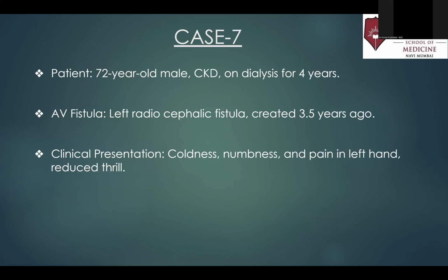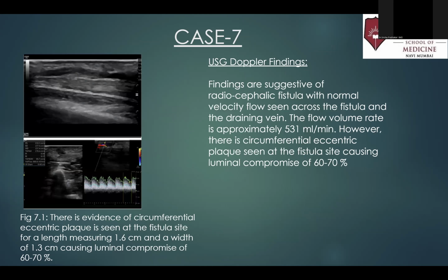Moving on to the seventh case, a 72-year-old male, CKD on dialysis for 4 years with a left radiocephalic fistula created 3.5 years ago, came with coldness, numbness, and pain in the left hand and reduced thrill. So here's where it gets interesting. When we did a Doppler, we saw that the flow volume across the fistula site was 531 ml per minute, which was a good flow.